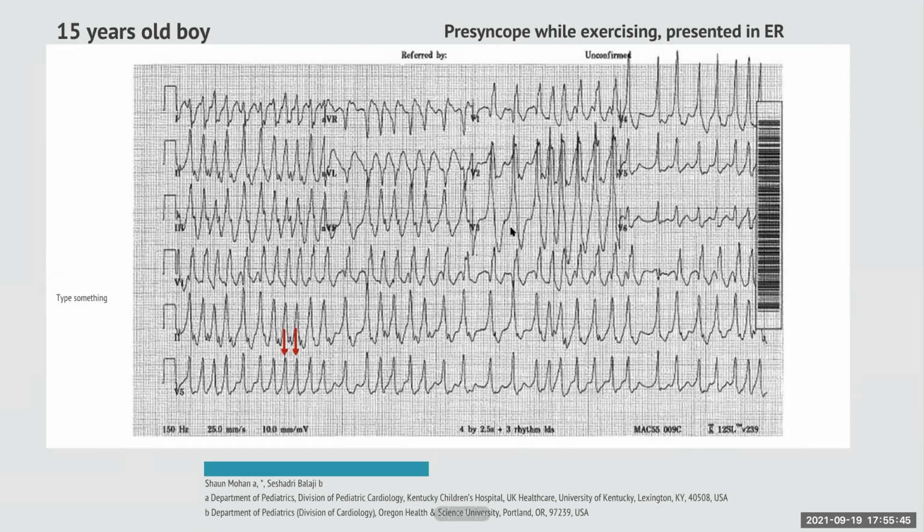Okay, so I want you to focus on the lateral leads here. Look at V4, V5, and V6. We'll go for each individual QRS. Look at this QRS. What's happening here? If you all can see my mouse, what do you think about this part of the QRS? Is it QT prolongation or something? What do you think? R wave. So yes, it's a tall R wave, but what do you think the initial part of the R wave is, is it slightly slurred or not?